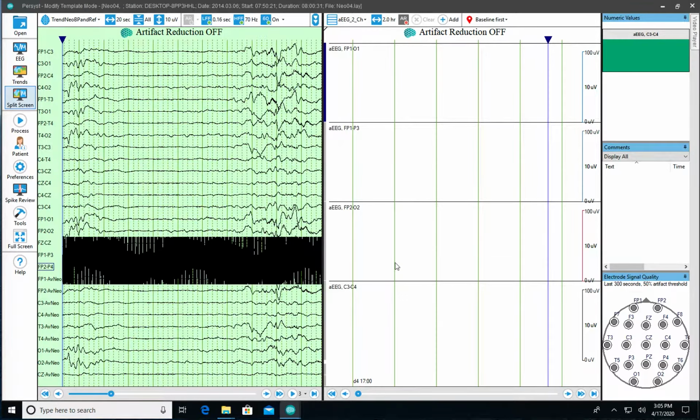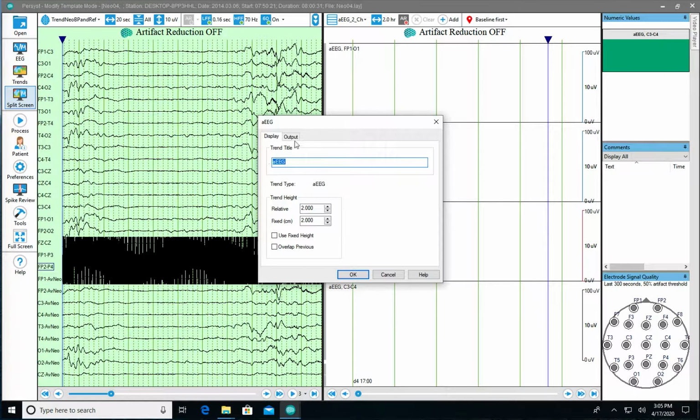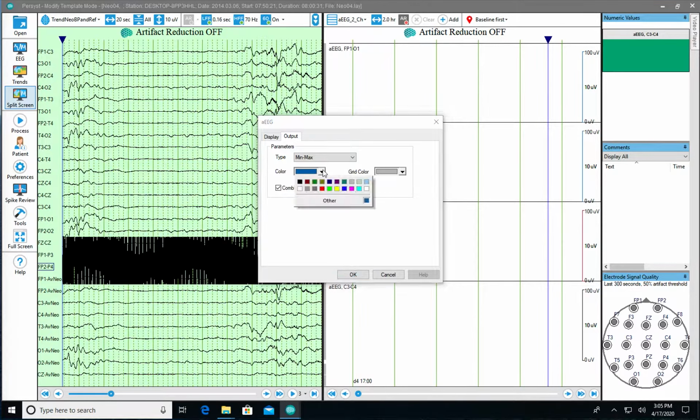I could make them all black. Well, why don't I do that? Because the other ones use the other conventions. So you can set them to any color you want. I'll show you where to do that actually while we're doing it. Let's double click or just single click on this when we go to the output. The color's there. It is a specific shade of red and blue, this one being blue for left. Specific shades of red and blue because red tends to look brighter. So they're color balanced. So that one doesn't look overwhelming compared to the other and grab your eye. So these are muted, both muted in a way to be color balanced.